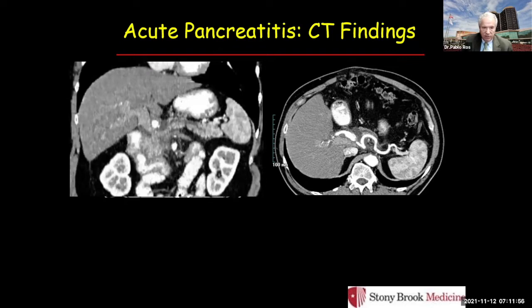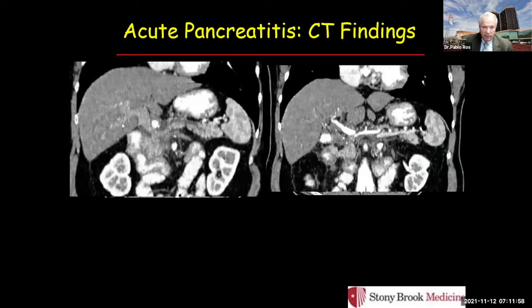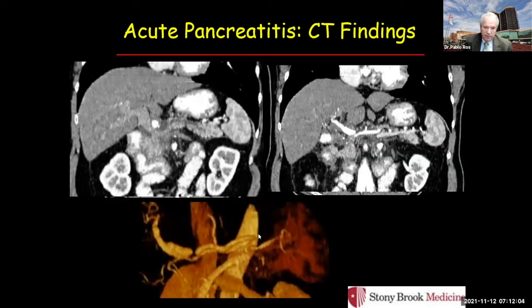That is the same patient, and you see, this is the prior patient, and this is the same patient with longitudinal pseudoaneurysm that you see here in this vascular three-dimensional color reconstruction. And obviously, pseudoaneurysm is very prone to bleed and have hemorrhagic necrotizing pancreatitis, which is very, very high mortality, almost 100%.